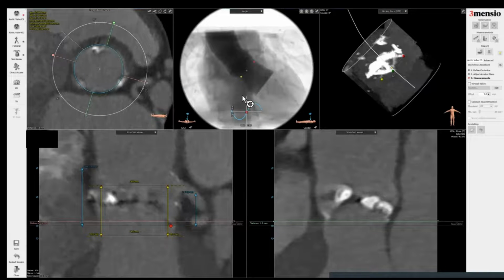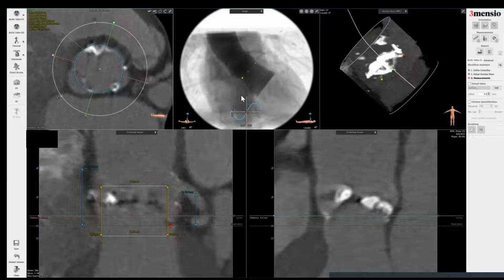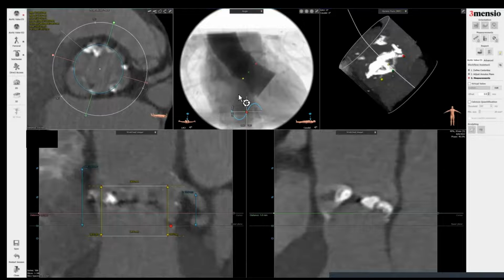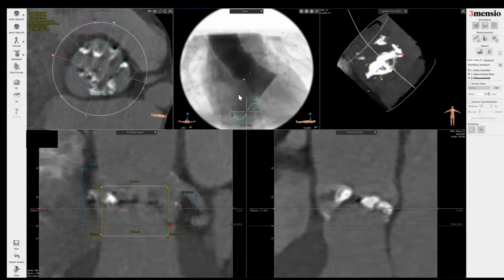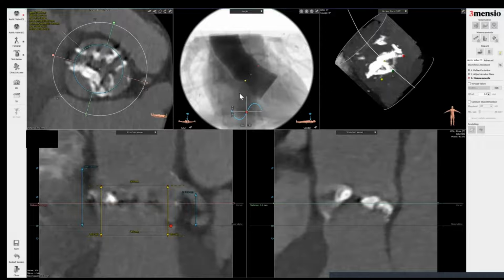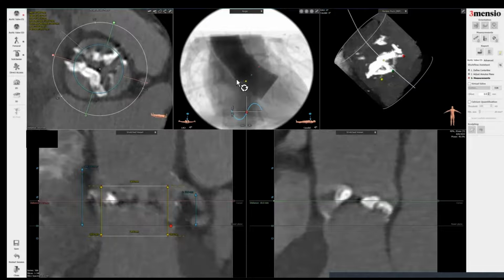And I'm going to go at a 1 millimeter cut increment just to see how this is very important, I think, in my mind, on bicuspid anatomy, because you want to see how it seals, if there's any risk of the raphe perforating the sinus, if there's any bulky leaflet facing the left main that might risk coronary obstruction. So while I'm talking here, I'm just going to save this all the way to the 7 millimeter, 8 millimeter. I do 10 just because it covers a lot of anatomy. And after a while, I think the sinuses disappear. So you know kind of already what the anatomy looks like and that's the risk.